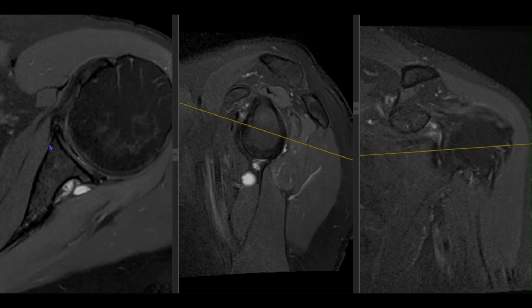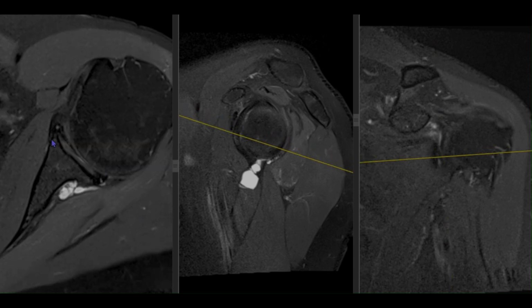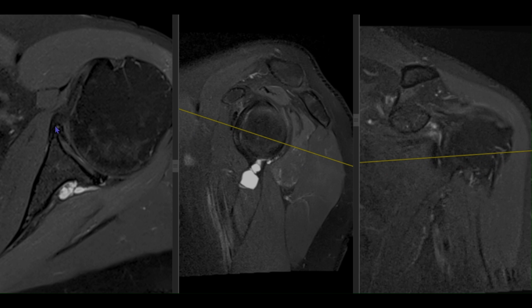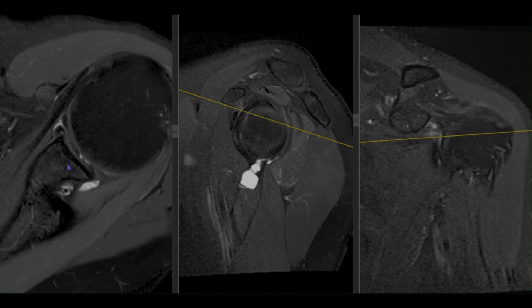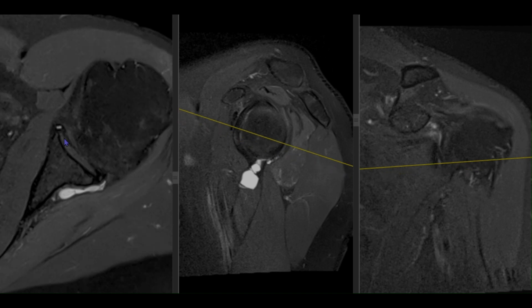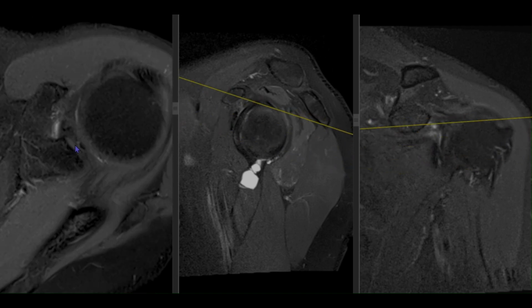So the fluid started somewhere around 2 o'clock position. So we'll just try and see whether we are able to appreciate this. So this is better seen on the sagittal images. There is some fluid in this region. So this corresponds to a small tear with a tiny paralabral cyst formation that is in the anterior aspect. Now we trace it up to 6 o'clock, it is good. Now we trace it again back at 1 o'clock position, 12 o'clock position.